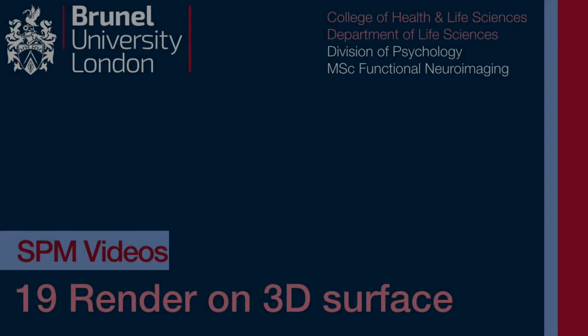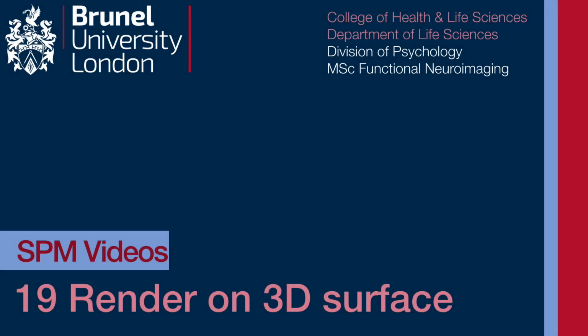You can probably tell from that these three-dimensional renders aren't necessarily the be-all and end-all, the ultimate way to visualize data. Sometimes they can be incredibly useful, sometimes they can be a little bit misleading, sometimes they're not the best way of visualizing or displaying data, but it's a good idea to know how to do all the different kinds of 3D visualization.